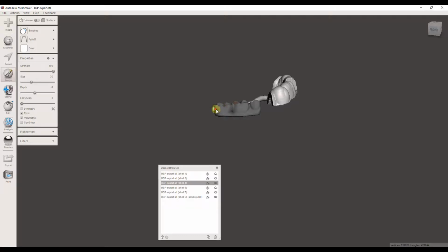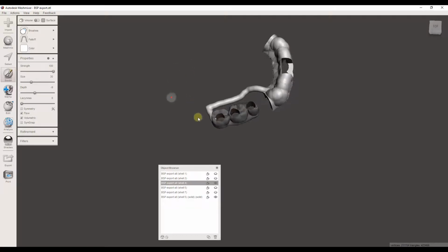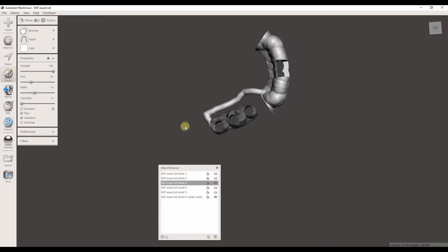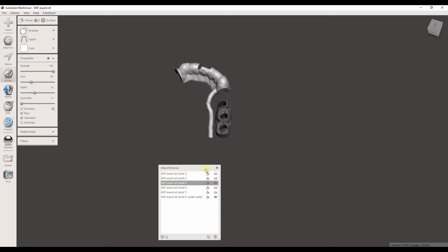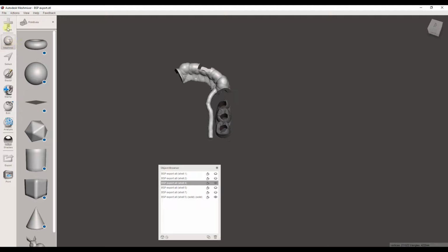And so now, you could draw through the material here. So if I click this and draw towards this, that tooth is blocking, you can't see, but you can do something like that to attach it. But I'm going to Control Z and undo it because I like having these connectors be pretty small so they break off easy.